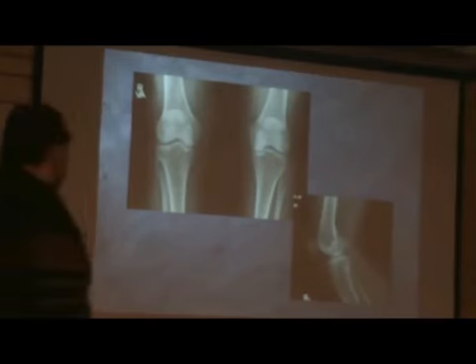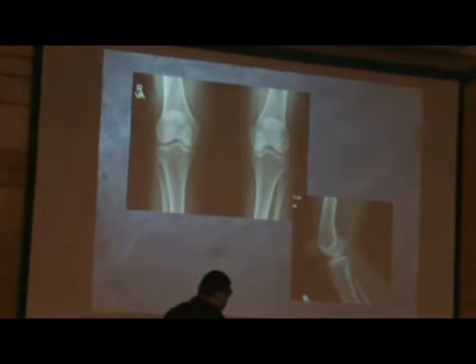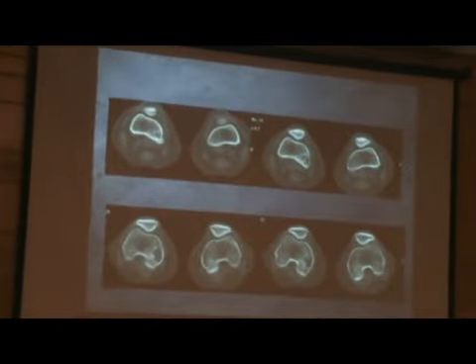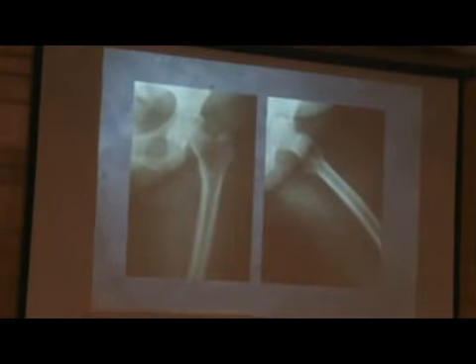The last group in the matrix is the dystrophic one. It's very difficult to see on this radiograph, but there's a little calcification associated with that lytic lesion. And look at the CT on these axial images, you can see that there is a cluster of calcification. So this was more of a dystrophic calcification on this patient.